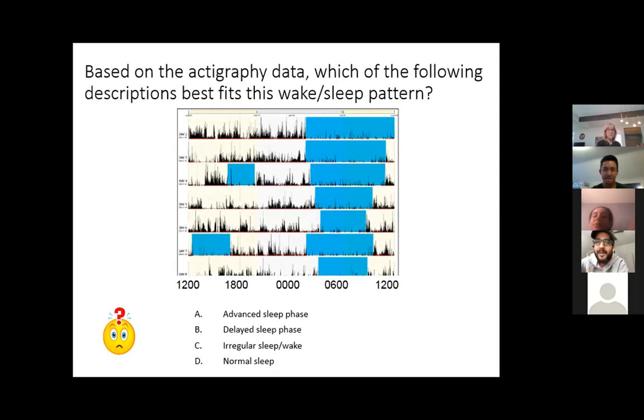So you looked at the wake time. The first top 2 days could potentially be the weekend, where he probably slept ad lib and slept a little longer, but it looks like a delayed pattern. What time's the person going to bed? Say around 2 to 3 a.m. All right. Strong work, everybody. You will see something like this in your board exam. All right. Ready for more fun?